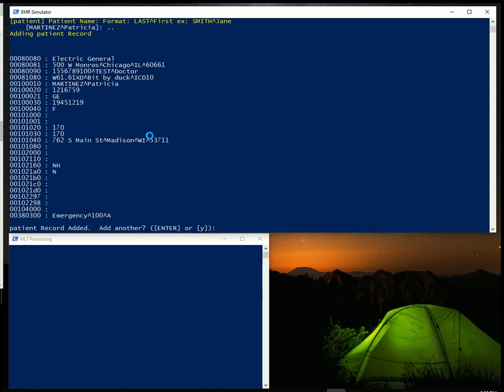You can see a lot of the tags. These are DICOM tags, by the way. A lot of them I'm leaving blank because it's just obscure stuff we don't care about. But if you wanted to put a value in for those, you could, if you're putting this registration info to test different things. And that's pretty much all the DICOM tags that are supported for the patient level in Modality Worklist. Not much else that you could do at the patient level for Modality Worklist.